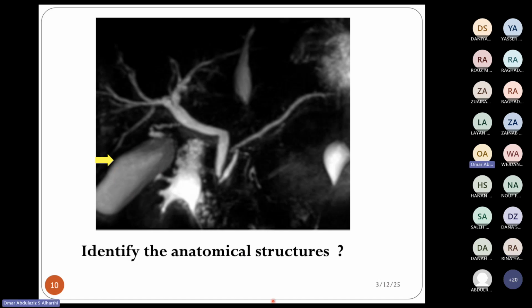Gallbladder. This one is hepatic duct. Okay, another answer. Pancreatic duct. This one, the hepatic. Which side? Left side. Left hepatic duct. And this one? Common hepatic duct, or common bile duct.